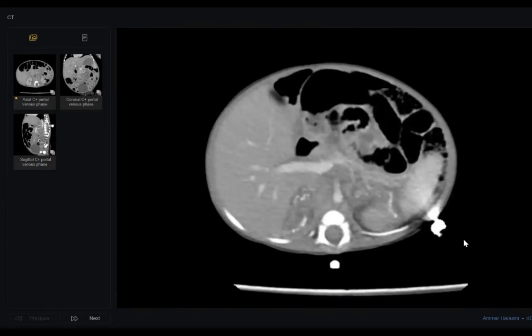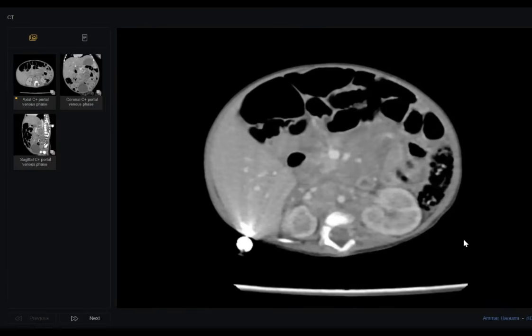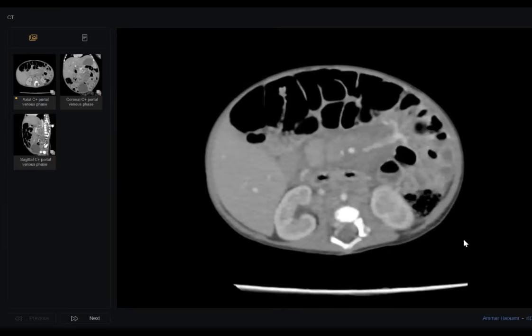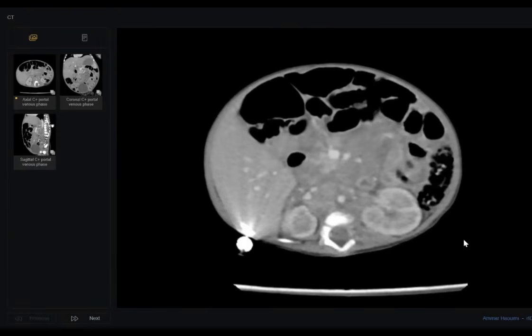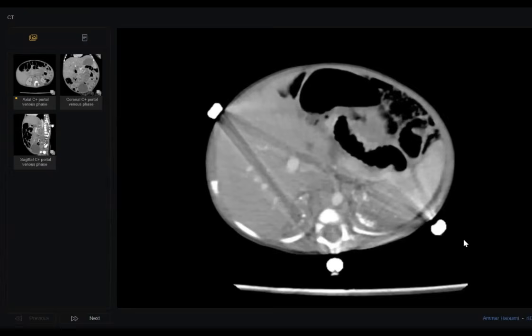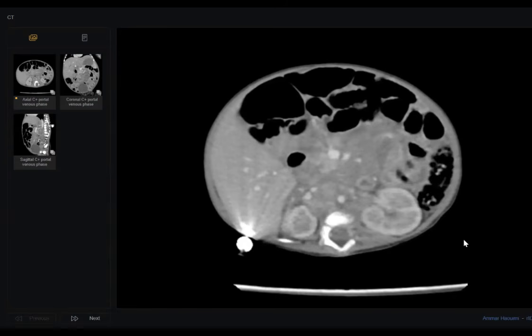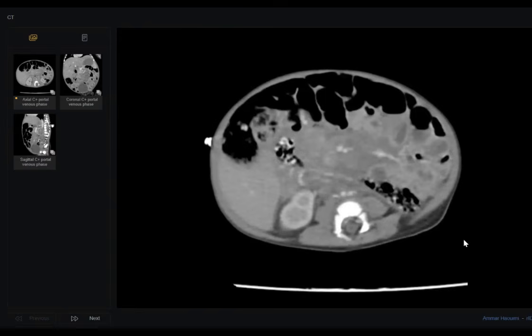multiple calcifications involving both adrenal glands. Could be due to neonatal hematoma or hemorrhage. And these hypodense masses are encasing the vessels, namely the superior mesenteric and the celiac. However, patency is still preserved. They are encasing the vessels with no mass effect, no calcification.